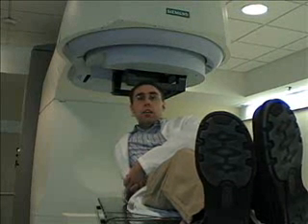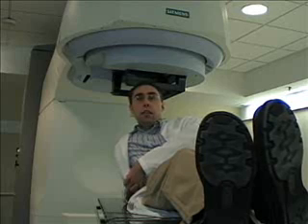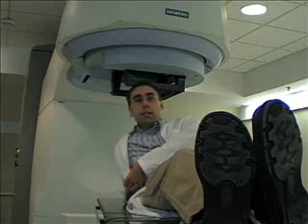These shifts will occur when isocenter is not in the correct location. Generally speaking, the doctor will tell you where isocenter should be placed. You just need to shift accordingly. Here are some samples. Just keep in mind, this is assuming the patient is supine, head first towards the gantry.